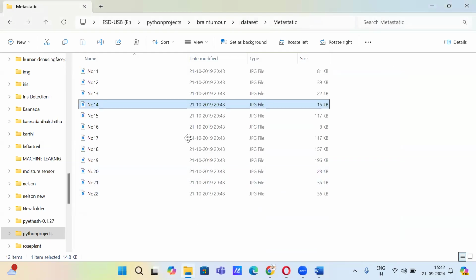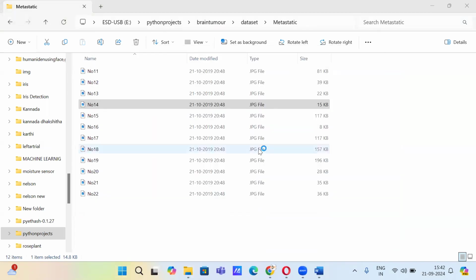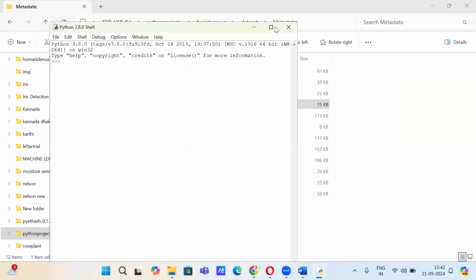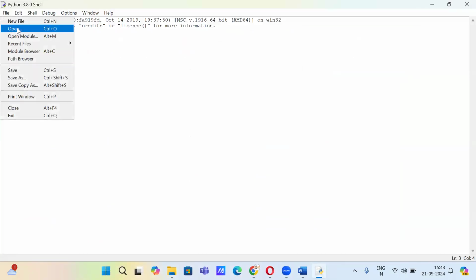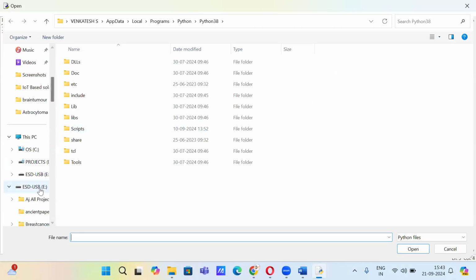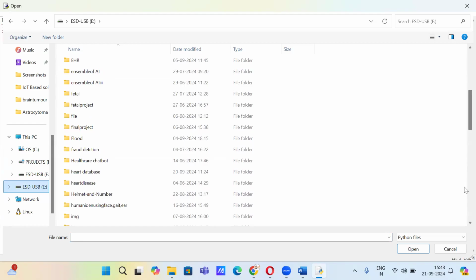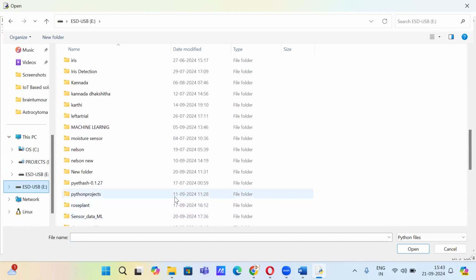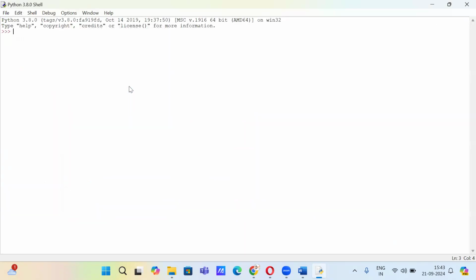Now we go for the training code. Click on open. File open. Click on training button.